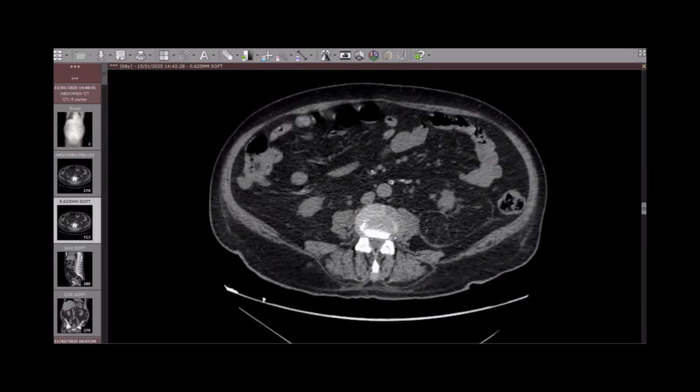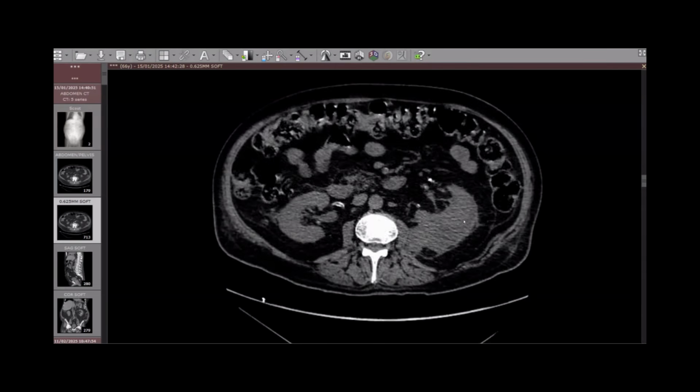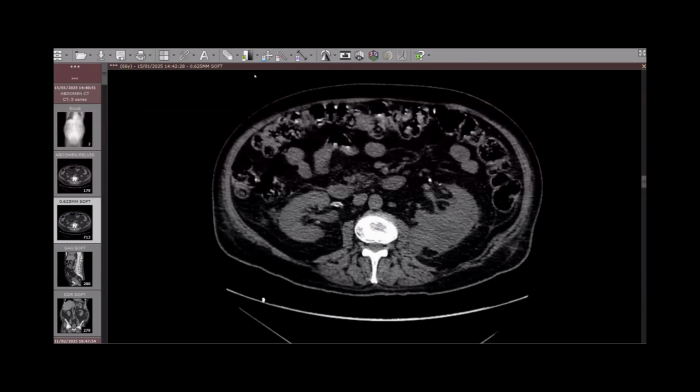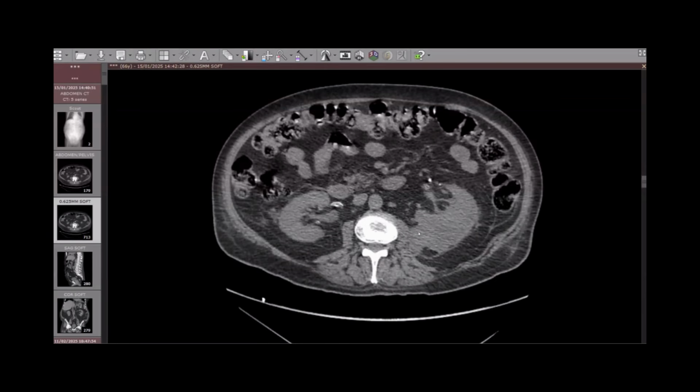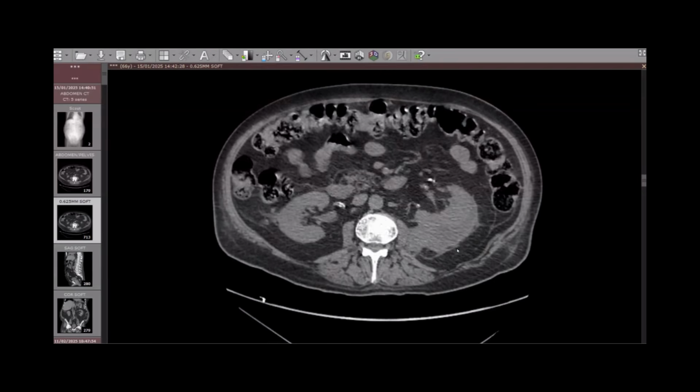So once we have a perinephric collection, because this one is perinephric, not subcapsular, because it's not indenting the renal parenchyma. It's irregular in shape, encircling the kidney. I know it's hard to differentiate, especially in a non-contrast study, but it's irregular and going into the perinephric space.